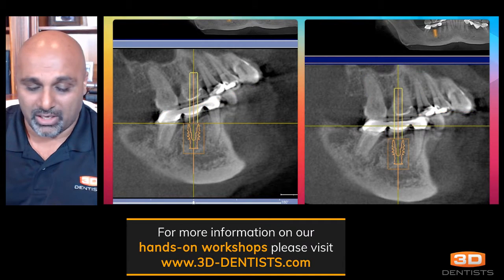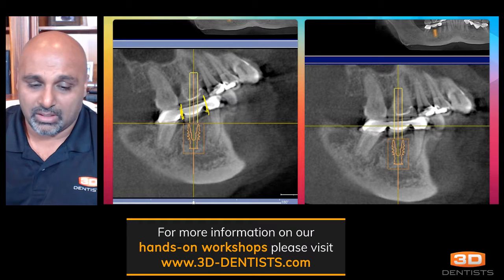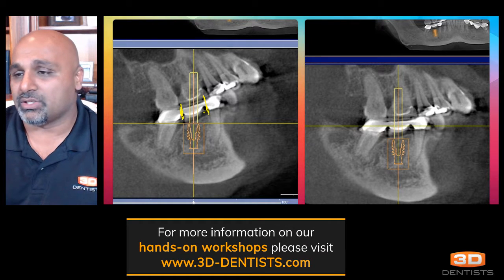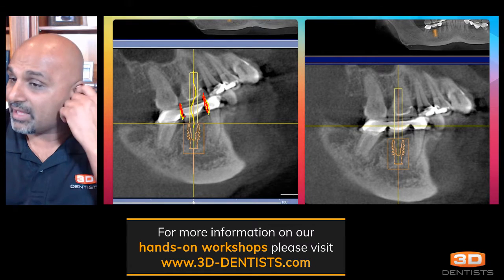The other thing I would like to point out here is one of the things that we're moving more and more towards, which is being able to do screw retained restorations. So one of the things I'm looking at with this particular plan is our screw access, as you can see represented here by the yellow box coming out of the implant in the software, is going to be like this. I can't draw very straight today. But our path of insertion is going to be these lines here. So let me see if I can make these in red. So our path of insertion is going to be kind of like that.